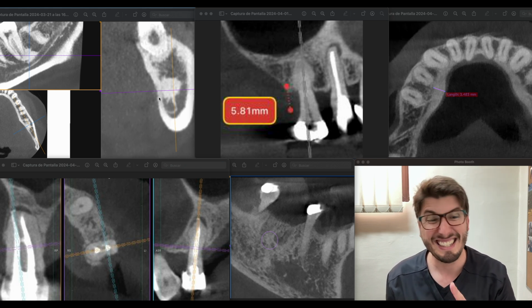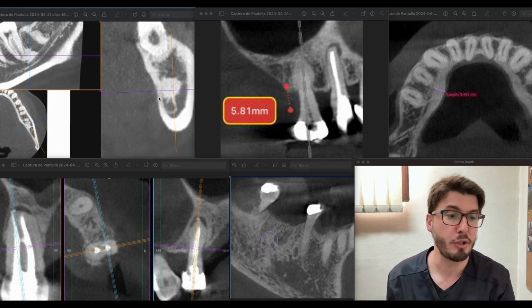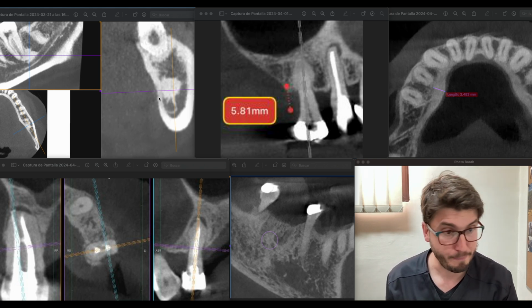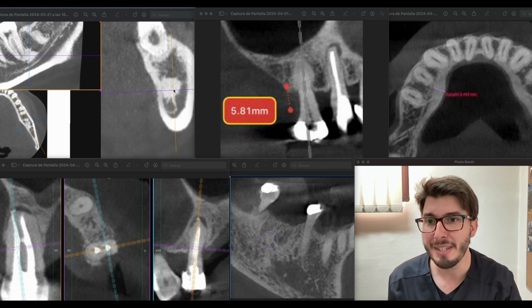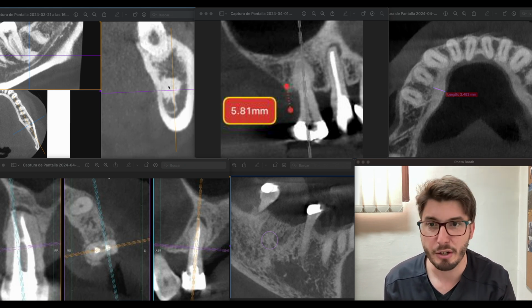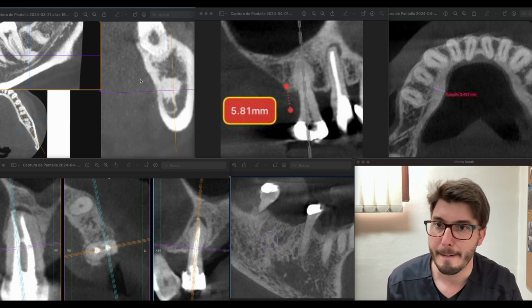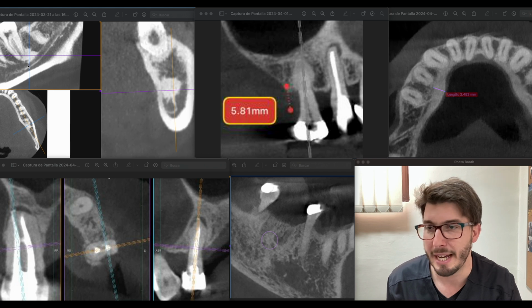So it's 14 times more common to see peripheral osteomas as compared to central osteomas in the jaws. Also, the osteomas will grow around the center of the lesion, will be more symmetric usually, although of course it's a neoplastic lesion, benign of course.